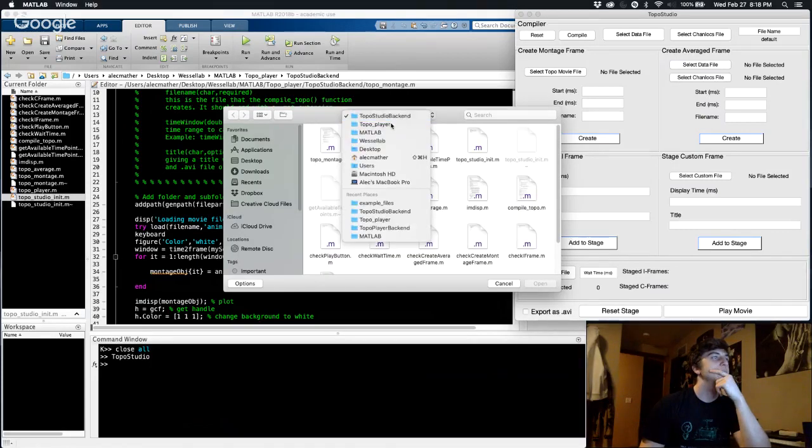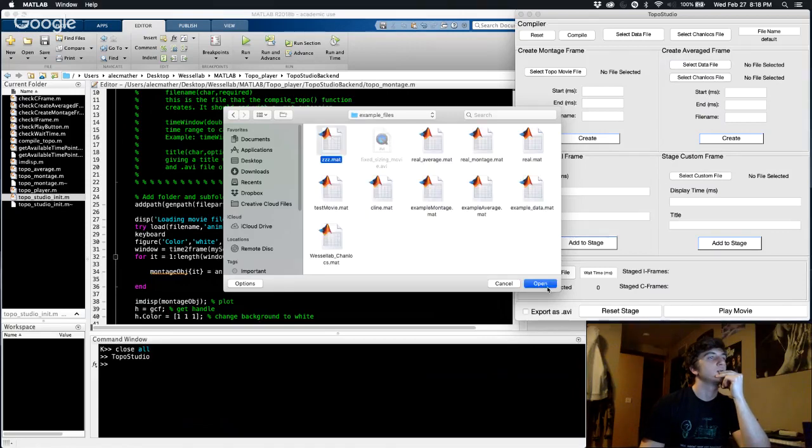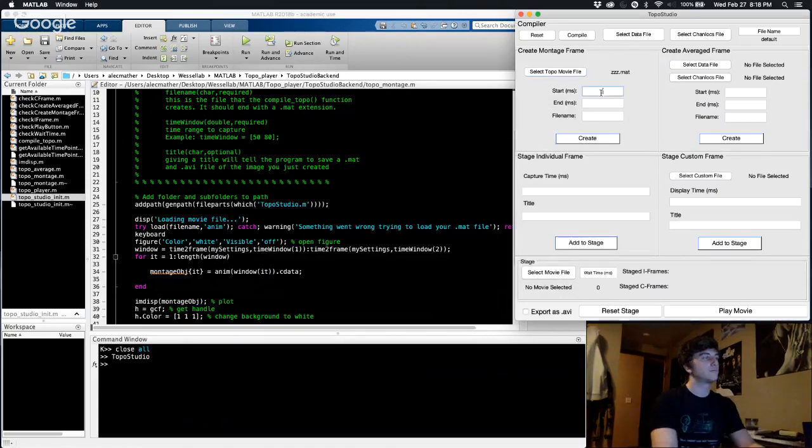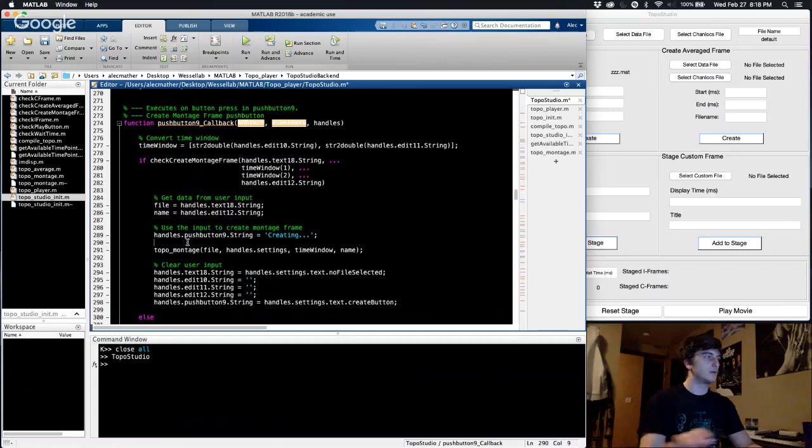Okay. Load in our movie file. Wait, before we do that, we don't want a keyboard into here.